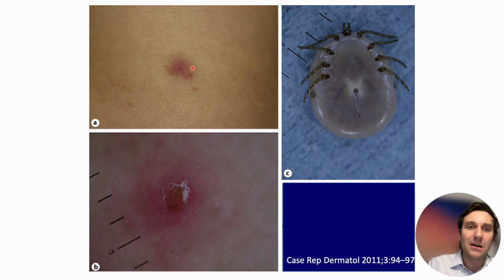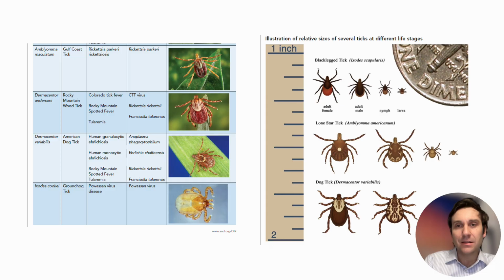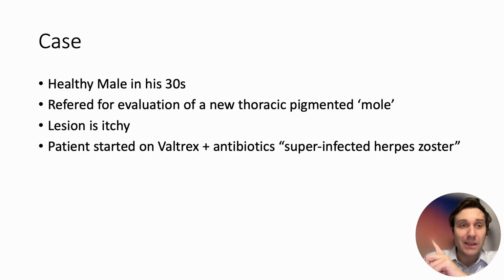You have this area here of erythema and you have the tick here. Very, very easy, right? And if you're going to read more, you have this AD, Derm World, featuring ticks, the size and everything. Let me show you just one case.